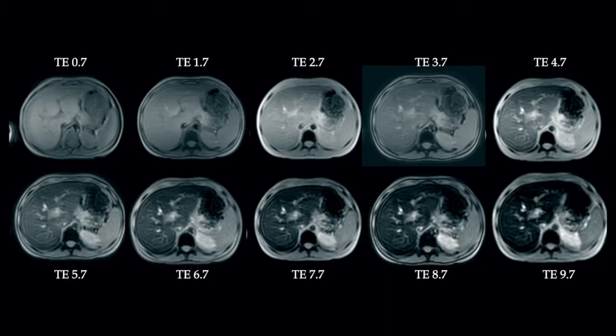So this is what the T2 star MRI sequence looks like. You can see there are 10 echoes applied in the slice of liver. The first TE is 0.7, the TE interval is around 1, and it has gradually increased till 9.7. If you carefully assess these images, you can see the intensity of the liver parenchyma decreases as the TE increases.